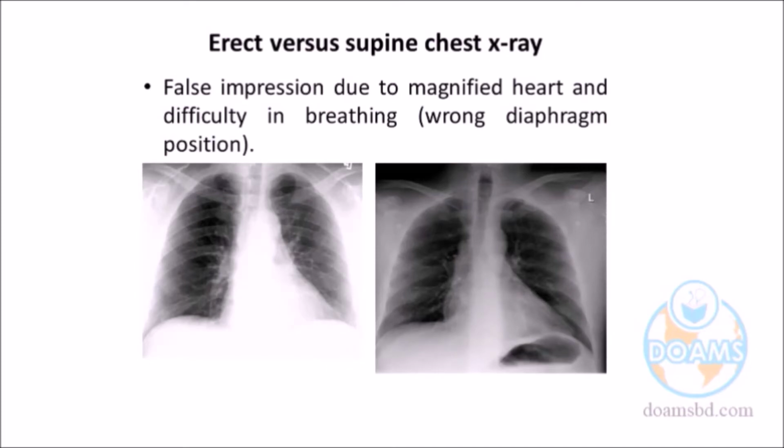In these X-rays, if there is cardiomegaly, we have to be cautious in giving an opinion on whether the heart is pathologically enlarged. Don't think the patient cannot have an enlarged heart, but we have to be very cautious to comment. If clinical symptoms and signs do not favor cardiomegaly, it might be due only to technical error.